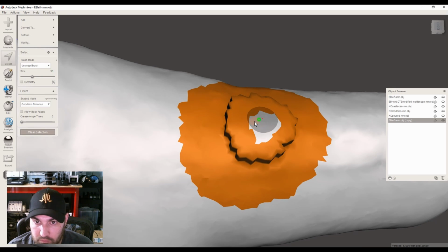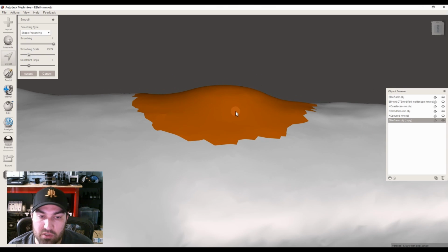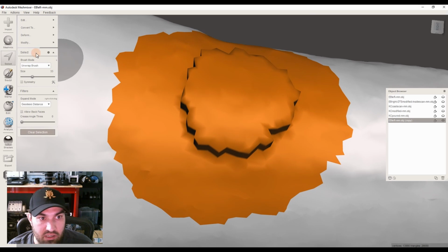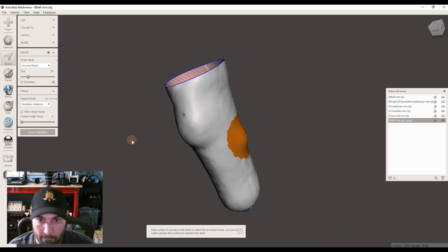Whereas if you selected that, then you're actually going to be smoothing all of that down together, and it'll start to take it away. So if you do a build up to a certain height and you want to make sure you keep that height, you just have to unselect a tiny little area in the middle, and that'll keep your max height there. So those are build ups.